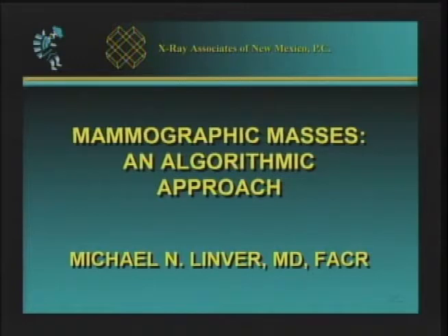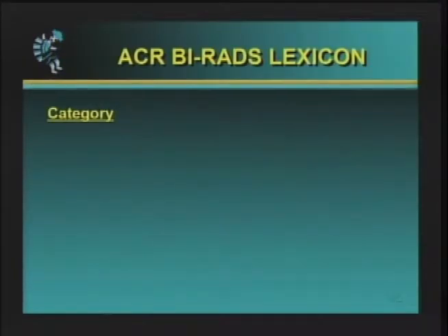I'd like to talk about mammographic masses now. I'm going to do this in terms of an algorithmic approach. Hopefully we'll cover all of the basics, getting to that aspect of the evaluation of masses along the way. When we talk about masses, it's nice to go back to the BI-RADS manual, which actually describes two aspects.